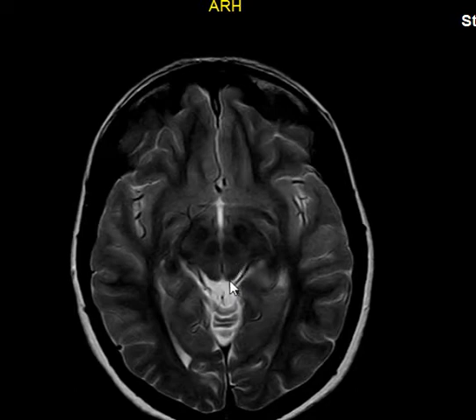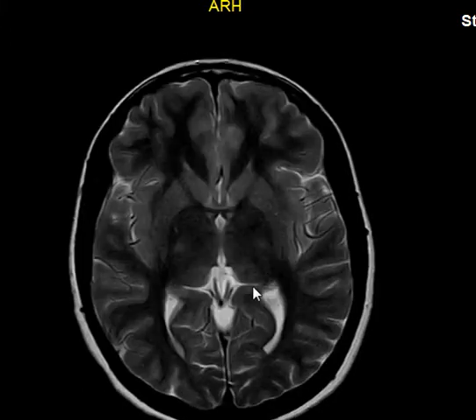Iron in MRI appears black, like hemosiderin, for example. That's why they appear dark. In brain anatomy, in the MRI of the brain, you should see them as dark dots because they contain iron. Why are they called red nuclei? Because they contain iron, from the gross anatomy. Yeah, exactly, from the gross anatomy, as you said.